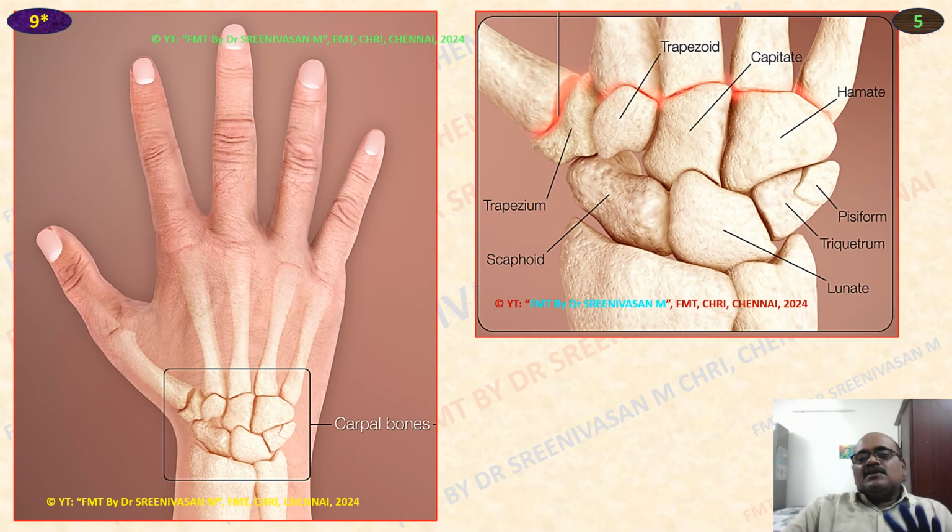So this is the cross structure of these carpal bones, where they are located. Underneath the lower end of radius is the scaphoid. From the radius to the ulnar side, that can be remembered by the mnemonic as I told: she looks too pretty. You can write it in the proximal row, that is SLTP. Then above that the distal row, try to catch her, TTCH. That is scaphoid, lunate, triquetral, pisiform. Pisiform is seen below the medial part of the lower end of ulna. You have to look for it more medially.